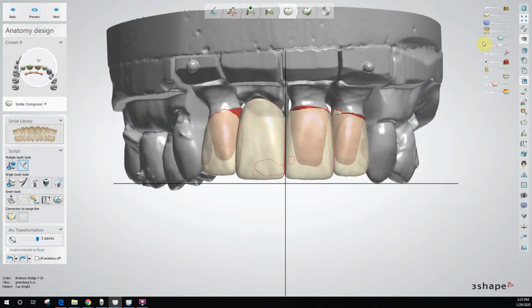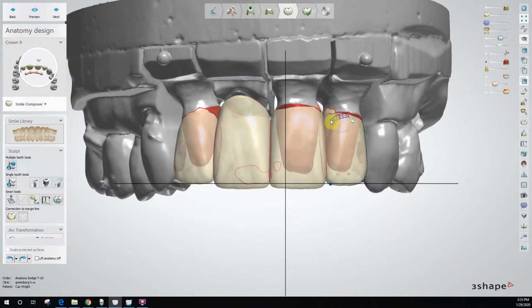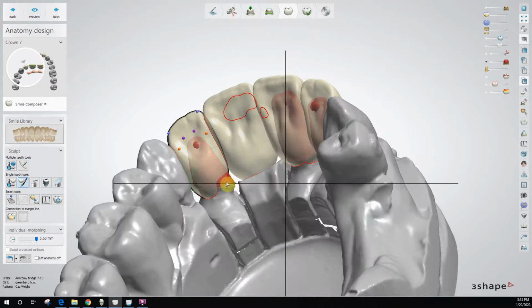Okay, I think we're looking fairly decent. Now I'm going to focus on getting things near my margins. Large circle of influence, control button. I'm going to slide up with the left click. Do it over here, control button, slide up with the left click with a really large circle of influence. The shift button will change that, and the scroll and shift will change that at the same time. Mind you, this entire time I've got my hand permanently fixed on the shift or the control button.